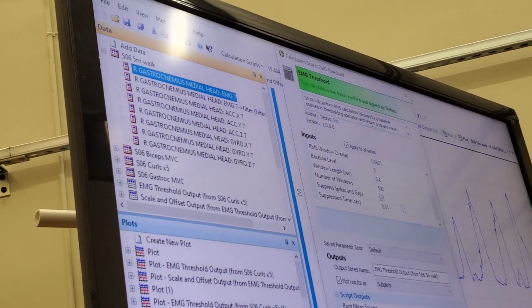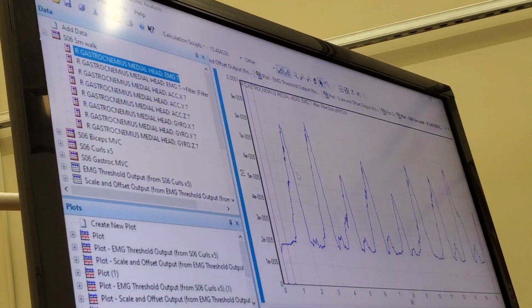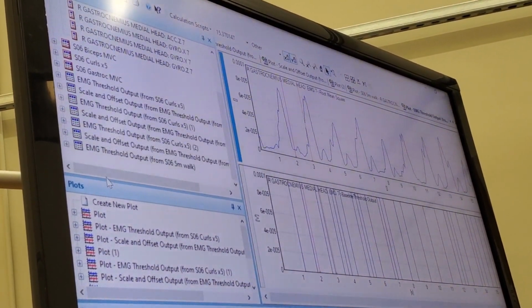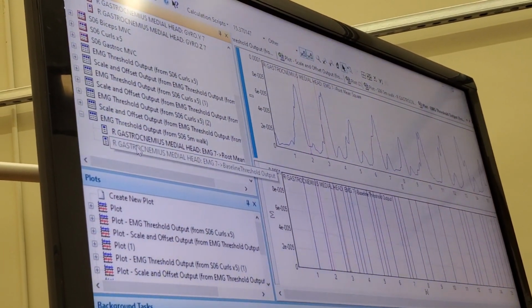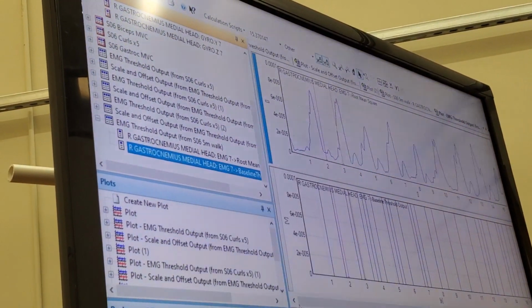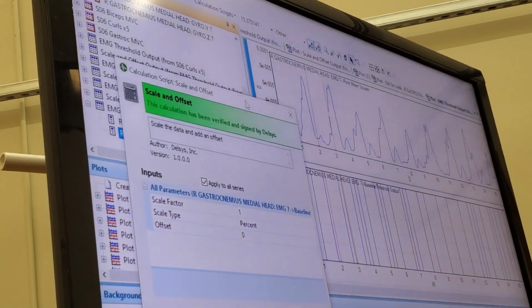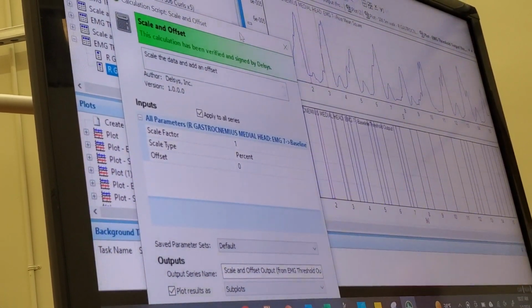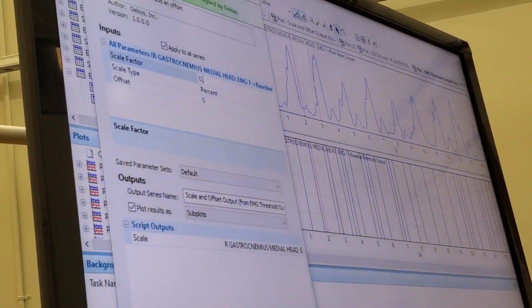So let's just go through normal, like I said. I think we're going to make some adjustments to this one too. Let's see. Yeah, let's just go to that top.